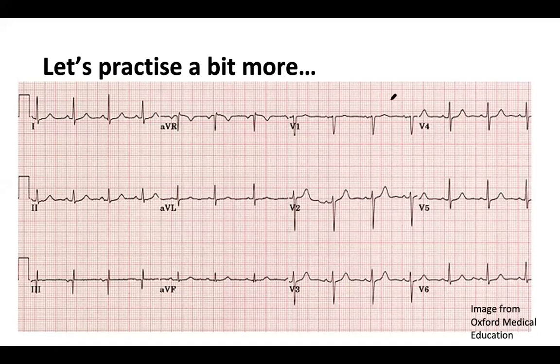Okay, so can anyone go through this ECG systematically? So go through everything we've gone through, starting with name, age of the patient.